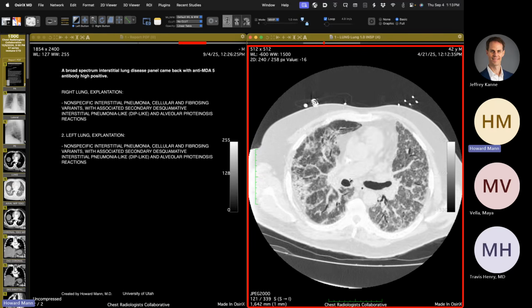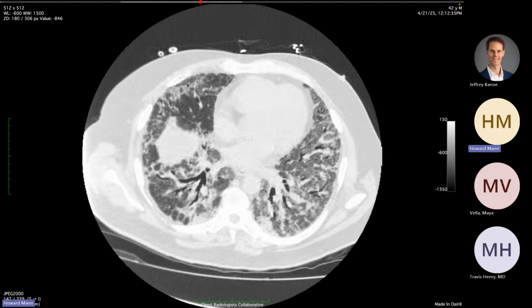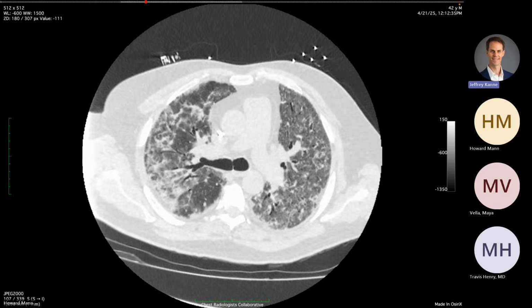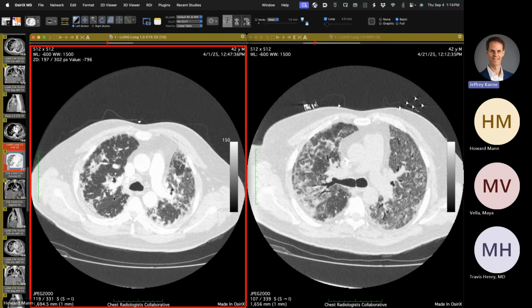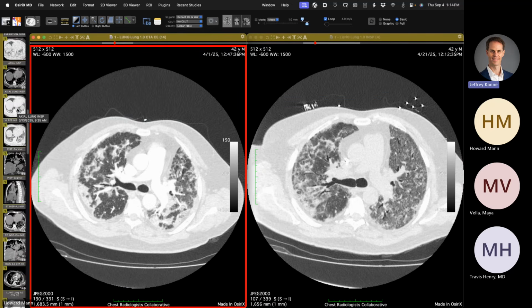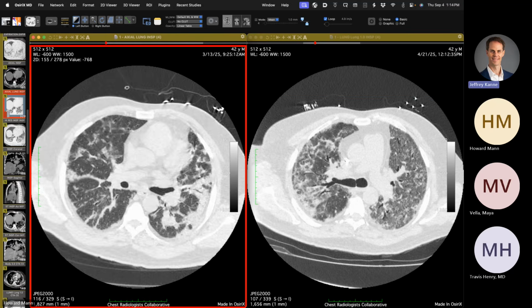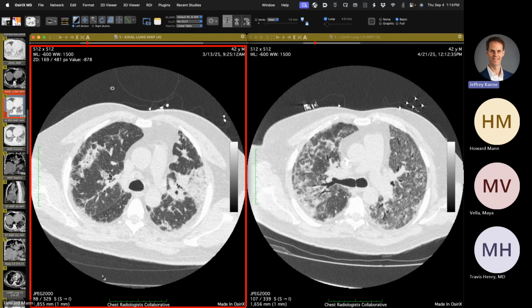And if you didn't have what looked like before, it would be hard to suggest any particular thing once you got to this stage. I mean, even the first images look very peribronchial. You often see this with anti-synthetase syndrome too. I think the pathology, we rarely biopsy them, so it's unusual to see it. But it's like you said, it's a mix, often organizing lung injury, but there's often rapid development of fibrosis. So over time, it starts looking like a more typical NSIP, but you have this thicker stuff around it that you sometimes see with an anti-synthetase.